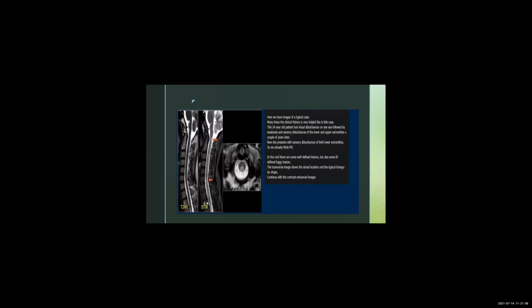This is called a STIR image. This is like the previous one, but the only difference is that they essentially nullify all the signal from the bone marrow. So if you look, the signal from the bones here looks darker than the one in T2. That's because it's all been suppressed. And it's helpful because you can tell if there's any abnormal fluid that's not marrow. So that's why this is a very useful sequence.